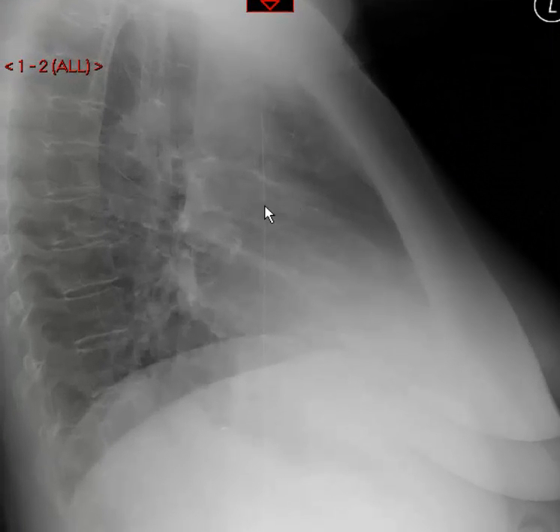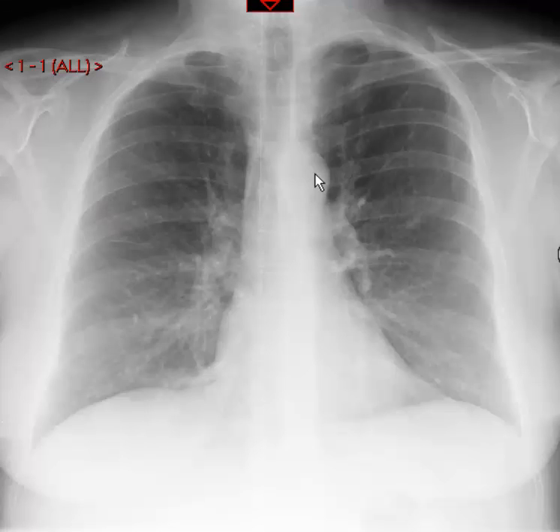So when we look at these things on chest x-ray, here's a frontal view, here's the aortic arch, here's the pulmonary trunk, in between is a little concavity, that's the aorticopulmonic window. And we look for fullness there because in some people with cancer, let's say it's spread to lymph nodes, there will be a fullness here from those lymph nodes that have maybe enlarged.